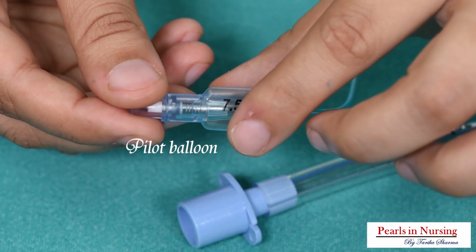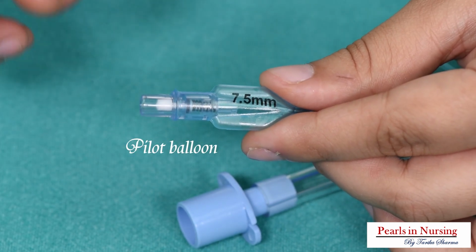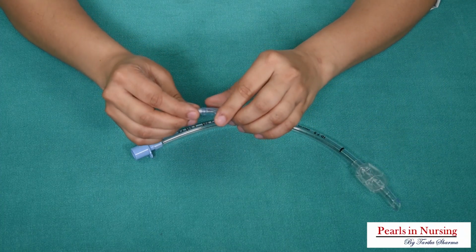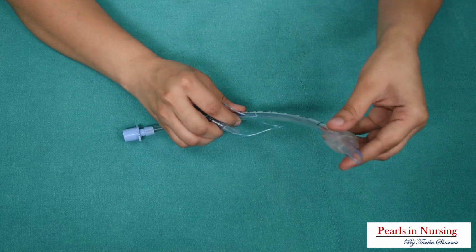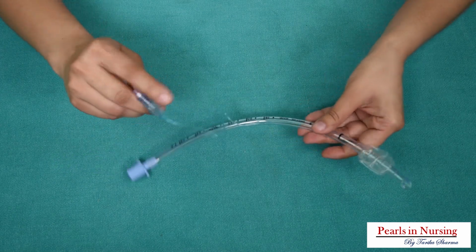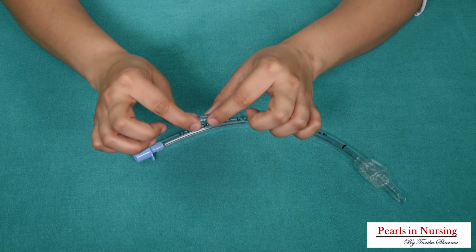So what you will do is, whenever we have to insert this tube, once we have inserted, we have to inflate the cuff. This portion is cuff of the tube. You will be inflating this with 5 to 10 ml of air so that the cuff is inflated and the tube is not moving inside the trachea, which will also prevent aspiration. Apart from that, it also has a one-way valve. You can see here, it has a one-way valve.